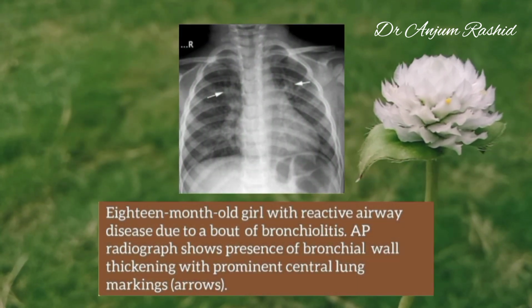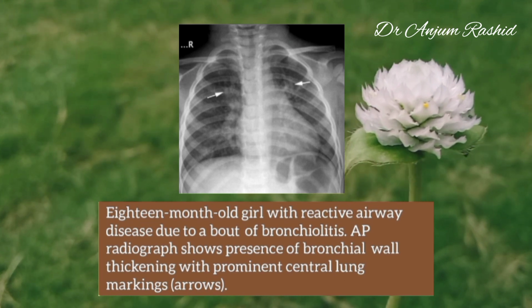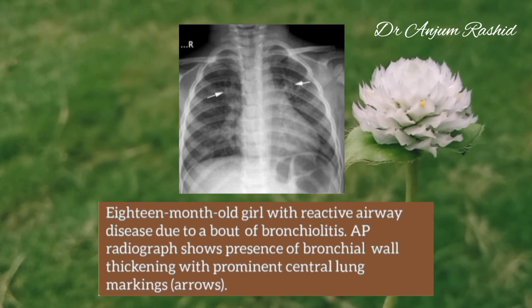Now, this is an 18-month-old girl with reactive airway disease due to a bout of bronchiolitis. AP radiograph shows presence of bronchial wall thickening with prominent central lung markings.